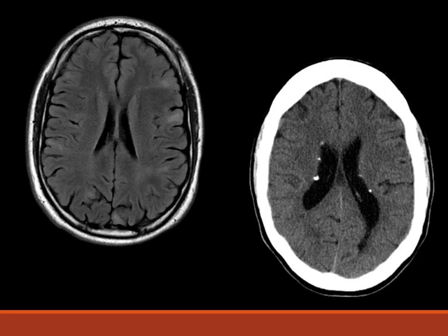tubers. These are hamartomas which look like triangular lesions with their apices pointing towards the ventricles. Almost all patients with tuberous sclerosis will have these tubers in the frontal lobes. They'll be low signal on T1 and high signal on T2.